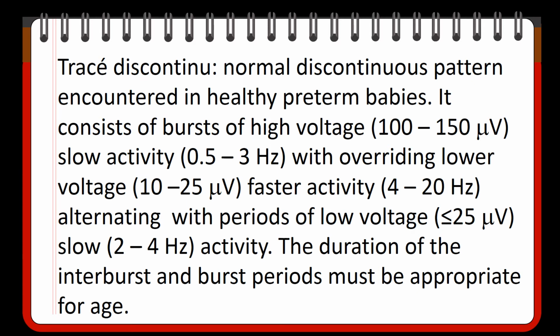Tracé discontinu can be defined as a normal pattern in a preterm neonate. Tracé discontinu is characterized by bursts of high voltage activity ranging from 100 to 150 microvolts.